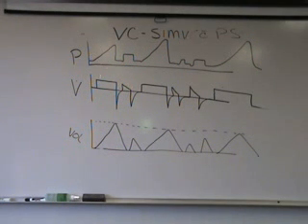My volume breaths, you see that I have drawn or set a square flow pattern. My pressure supported breaths, you see that I have drawn a decelerating flow pattern. And notice that it's not linear like something that I would set. It's something that just occurs because of the pressure difference between the ventilator circuit and my patient's lungs.